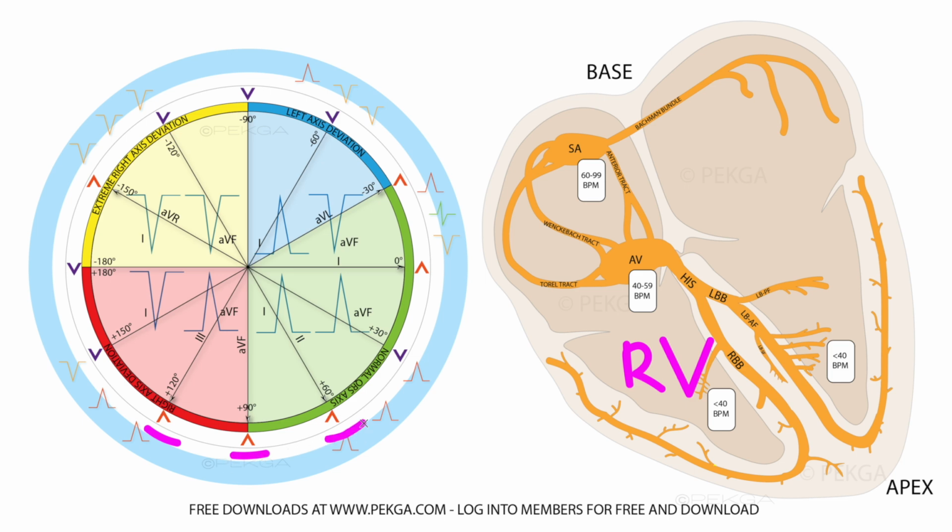Now these are the positive ends, the positive electrodes of these leads. And if the QRS is upright in those leads, it means that the signal is moving towards them, which would place the point of origin somewhere higher.